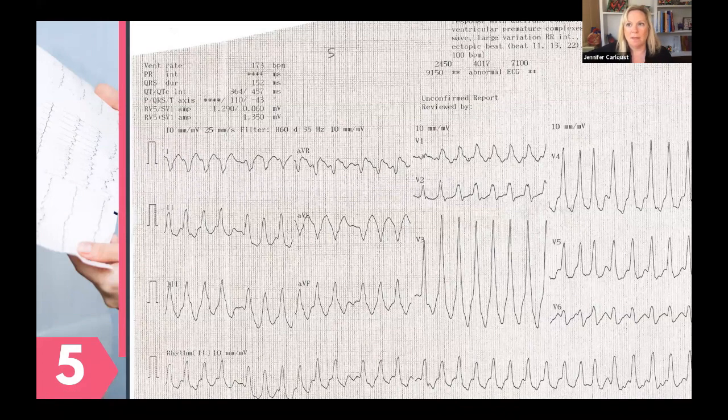Well, the electrical impulses are actually taking a different pathway down the ventricles. So what's actually happening here is this patient has an underlying Wolff-Parkinson-White. Okay, so what you'll hopefully notice is that the beginning of the complex looks slurred here, and there's a delta wave.